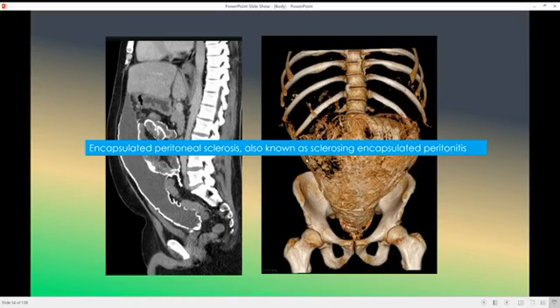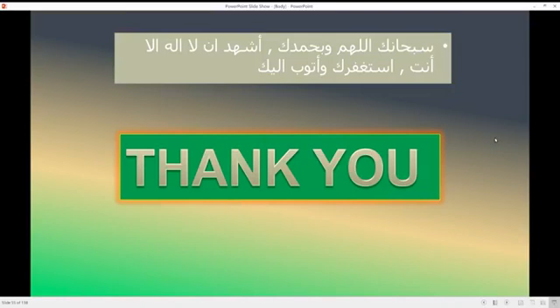It looks like a cocoon, and sometimes the patient presents with obstruction. This is due to calcification, one of the complications of dialysis. This is called encapsulating peritoneal sclerosis or sclerosing encapsulating peritonitis. This is the last case.